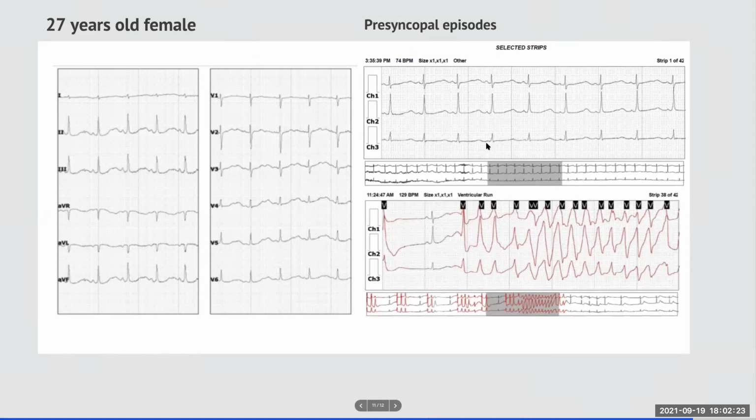And this is what happened to this. So this is a spot diagnosis. Who's going to shout out? What is it? So this is torsade. Okay. Torsade, sorry. So this is torsade in somebody with a long QT interval caught on the Holter.